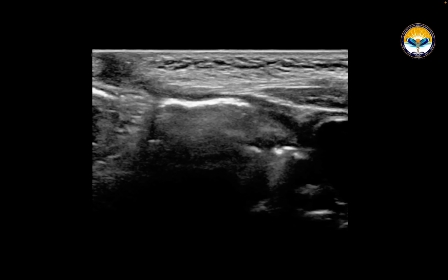we can see a tubular structure originating from the umbilicus and extending towards the bladder. So we can see that a fistula tract terminates at the bladder, forming an abnormal communication between the urachus and the bladder. However, there is no evidence of any cyst or cystic structure in the course of the tract. So these findings are suggestive of urachal fistula.